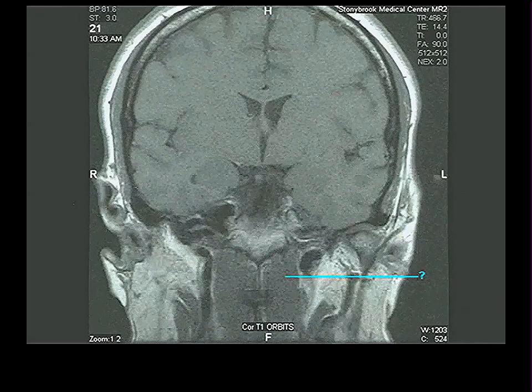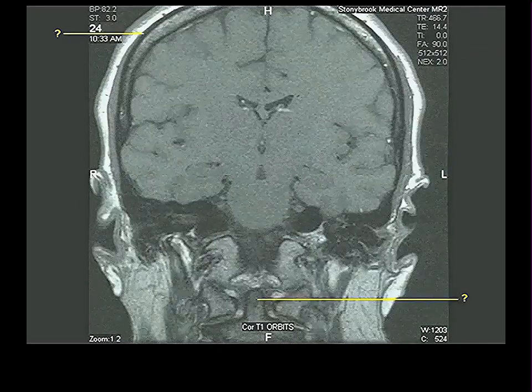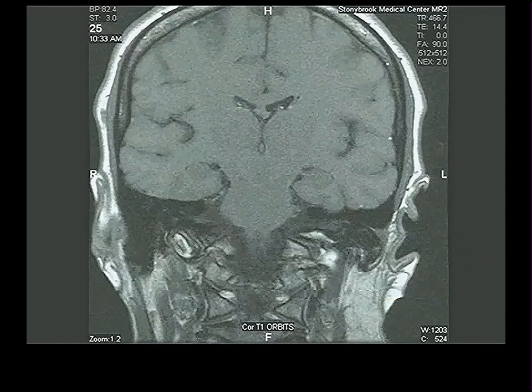And here's the longus capitis. I'll just tell you what it is, seen in MR. That's the dens. Bone. And the answer to this is bone, the outer table, to be specific.